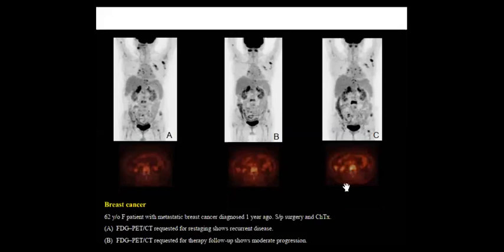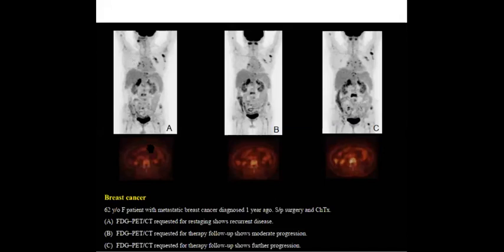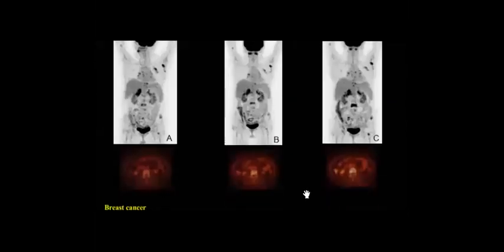Is it more progression or regression? Yeah, this is in the colon, maybe physiological, maybe colitis. Yes. So more progression. So again, this is the role of PET-CT here, that you see if it is baseline or maybe restaging. According to the stage, then after that you do follow-up and you see the patient after chemotherapy treatment, whether he's okay or not.